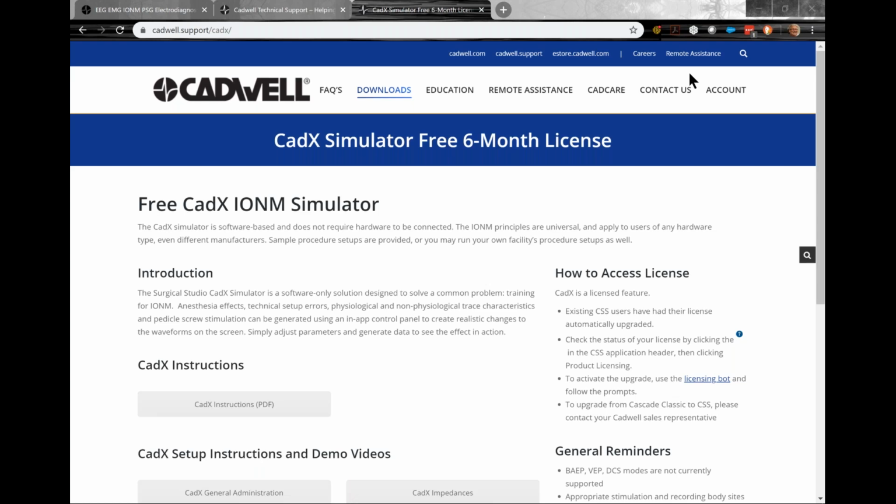I don't know what you think, John, but if this is the same procedure file you've used before, I'm not sure I have an answer, but generally it could be you've got more than 32 channels in use. If this wasn't made specifically in Surgical Studio, sometimes when you export out of Classic and import into Surgical Studio, the multiple tests functionality is a little tricky to take care of. So you do have to verify that. It almost sounds like you had too many channels in use at one time. Do you have any opinion on that, John?